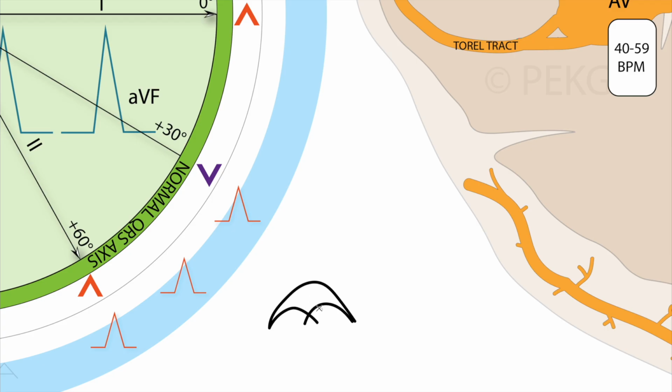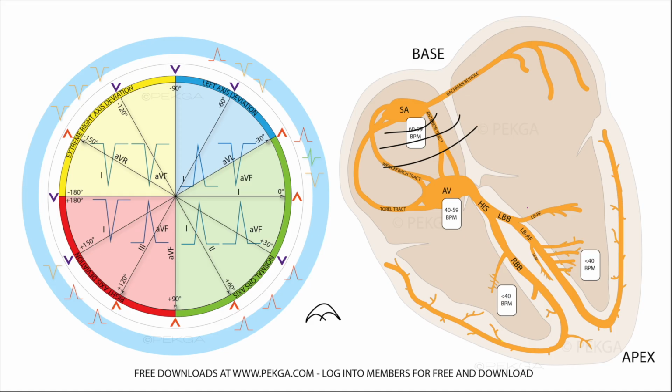But when you add these two waves up on an ECG machine, the only thing you see is this big hill, which we call your P wave. Now, when you have left atrial enlargement, and let me switch colors.